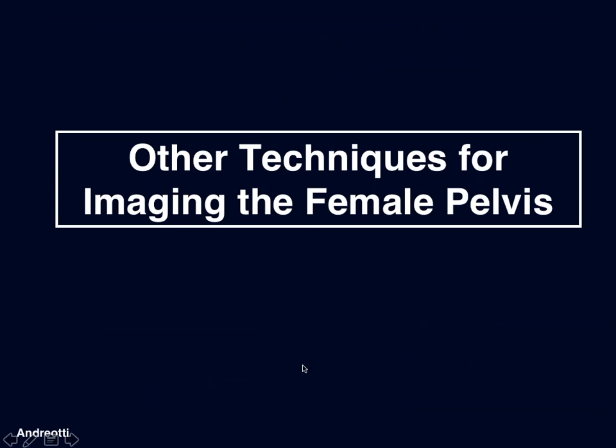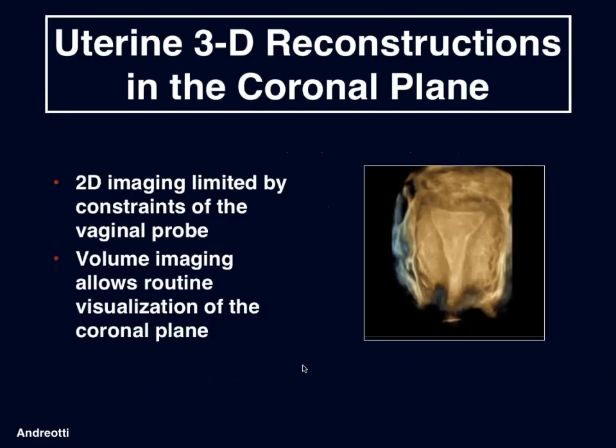So let's move on now to other techniques for imaging the female pelvis. As I mentioned briefly, we can perform 3D reconstructions of the uterus and the coronal plane.